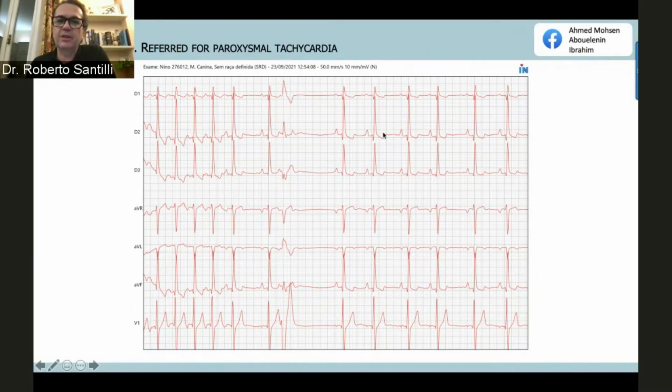if you compare this to this. And in some parts, what you see is actually the P prime that goes on top of the previous T. But for sure, also when the P is not falling in the previous T, it's less deep.